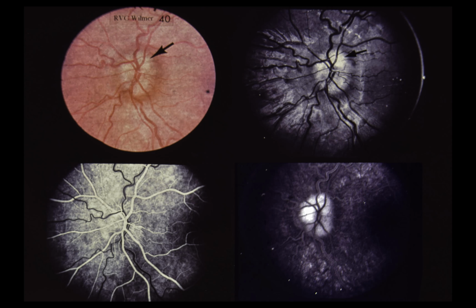This 10-year-old male complained of intermittent headaches unassociated with nausea or vomiting. He had no neurologic findings. Visual acuity was 20/20 right eye and 20/15 left eye, with normal color vision and slightly enlarged blind spots. Upper left. The left optic disc is elevated, but normal nerve fiber layer striations are visible. The retinal vessels are tortuous but are not obscured as they cross the disc surface. A small mass is barely visible at the superior disc margin.